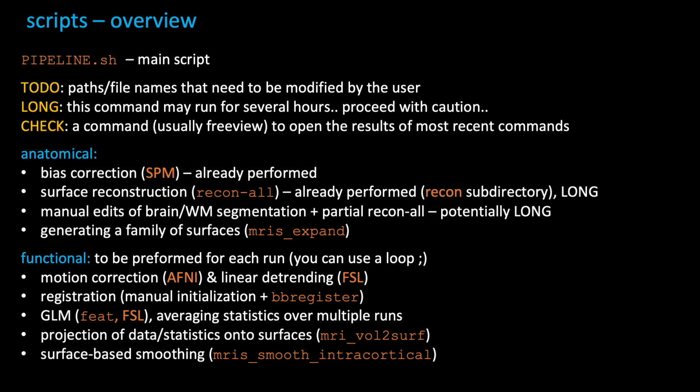LONG is a tag that I use to mark the commands that will run potentially for several hours, depending on how good the machines we're working on are. So you may want to just leave them for later, because you're definitely not going to see the results within the time frame that we have.